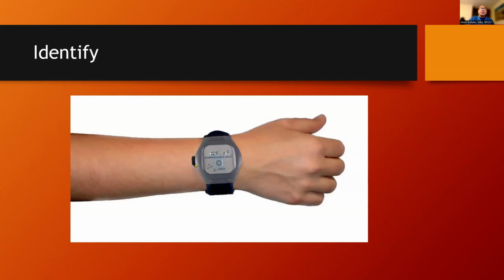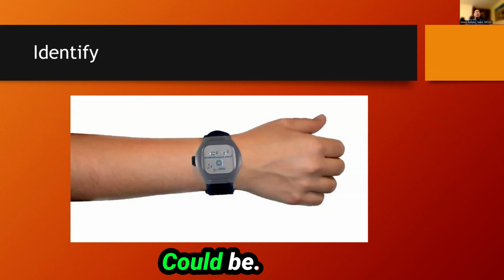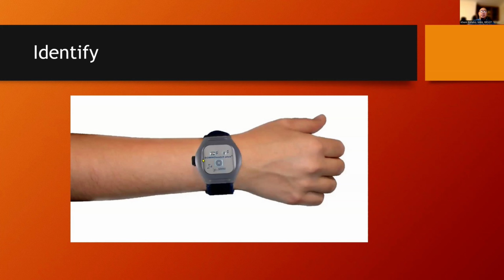All right. And what is this? Don't tell me it's an Apple Watch. Could be. It has the name there too. I should have covered the name because I'm not marketing for these companies. What is this?